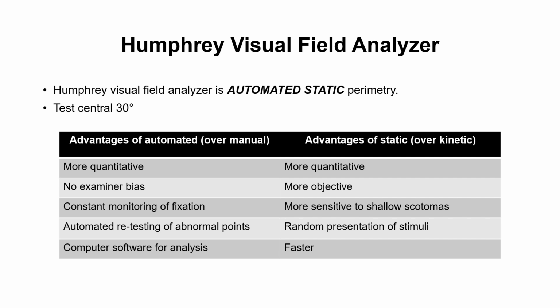And what are the advantages of static over kinetic? It's also more quantitative, more objective, more sensitive to shallow scotomas, and there is random presentation of stimuli, so there is less anticipation from the patient, and it's also faster.